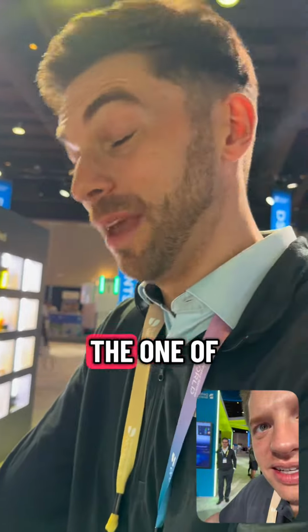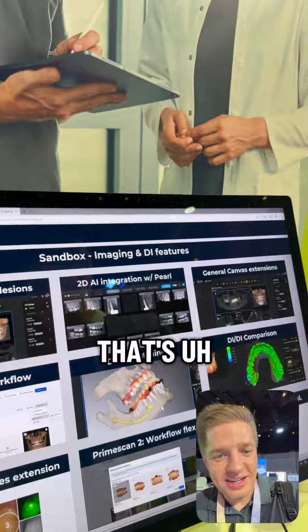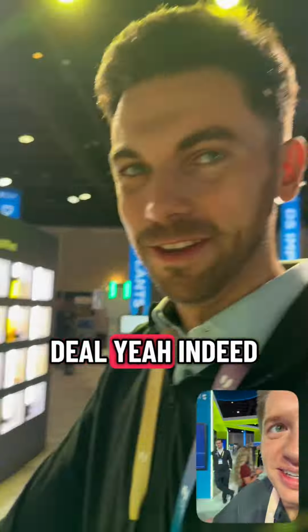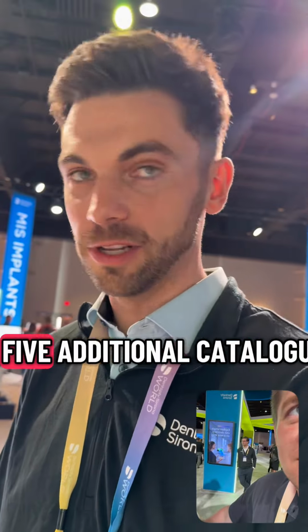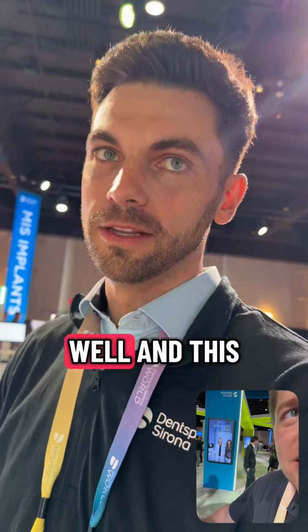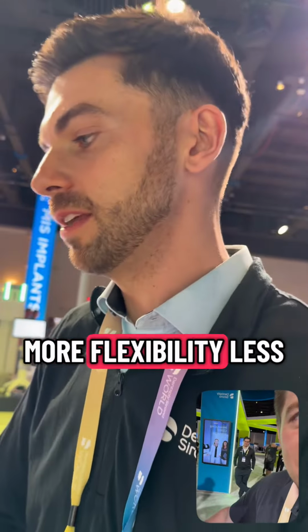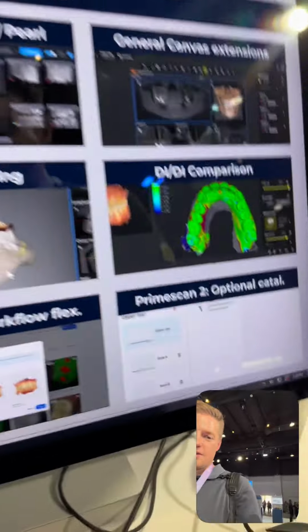That's basically one of the main feedbacks. Did you hear that? Optional catalogs? That's a big deal. Indeed. Okay. And so for treatment scans, there will be the possibility to add a total of 5 additional catalogs. Amazing. 2 for the upper, 2 for the lower, for the buccal as well. And this also brings more flexibility, less rigid workflows. So that's the final extension that we'll have.